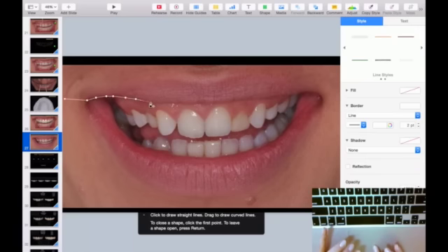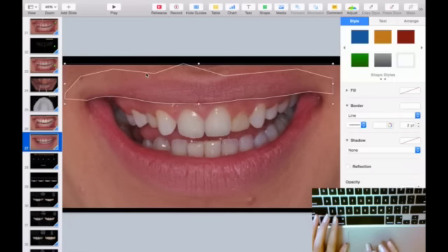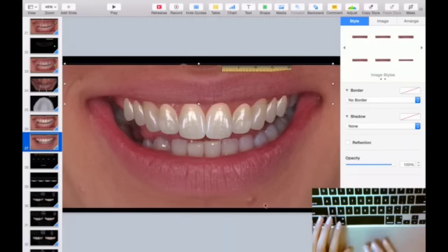The important thing is that we get really here where the lip is running, because it's gonna go on top of our new DSD teeth. The rest of it doesn't matter much. You can just do whatever and click both, mask, enter. So we already have it there.